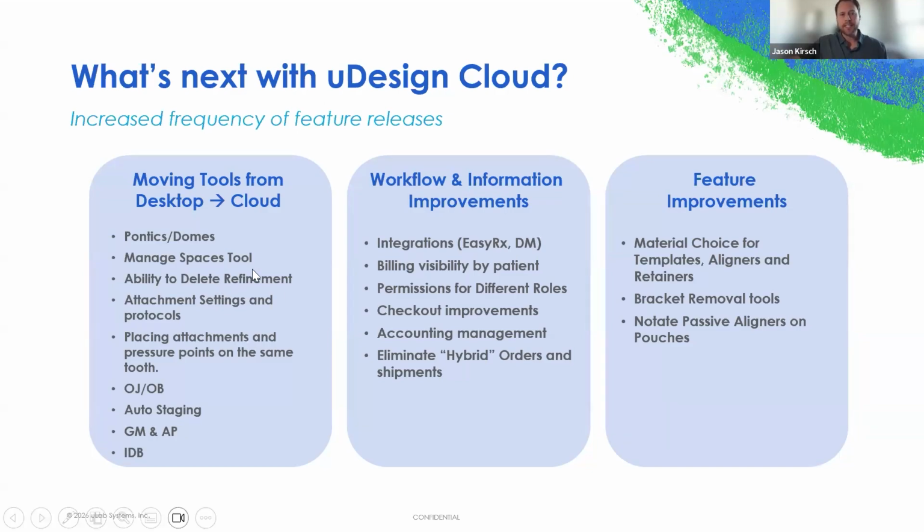We're going to add in the ability to delete the refinements. So if you've uploaded a scan, or maybe you uploaded the wrong scan and you wanted to delete it, you're going to be able to do that pretty soon. There's a whole list of other tools. We're adding in global movement. IDB currently is only available on the desktop app as well. We're going to add that over as well.